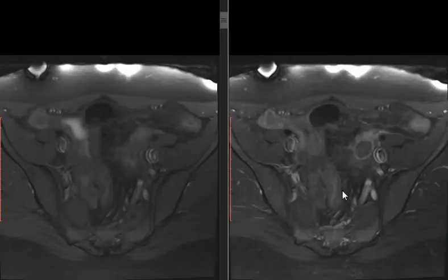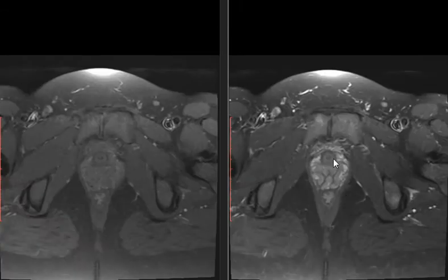So, first of all, let's start step by step. What does it look like to you? What would you say in the differential diagnosis part? Mass in T2 is hyper. In T1 we don't know. I'm telling you, it's hypo on T1. Okay. It's showing post-contrast enhancement, septa and wall. It's infiltrative, encasing everything but not compressing, without mass effect. Okay. It's in a young female, 32.